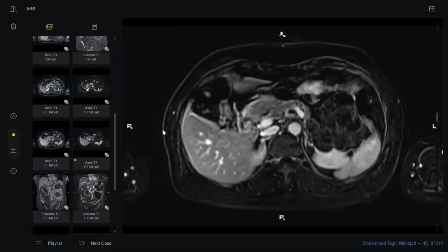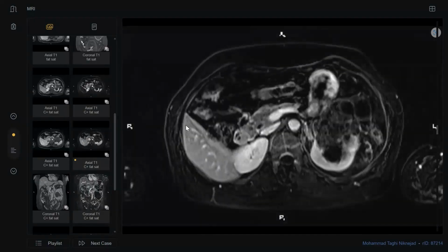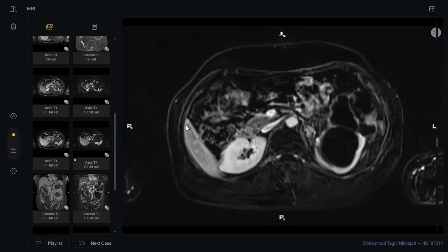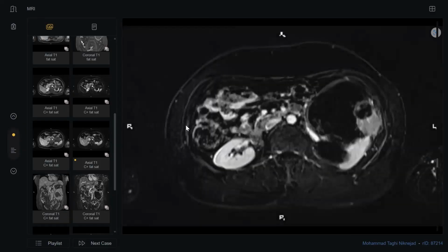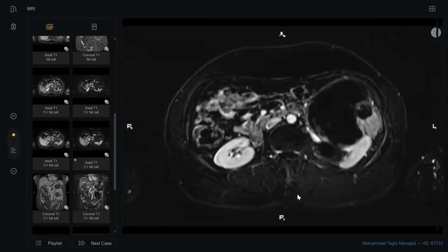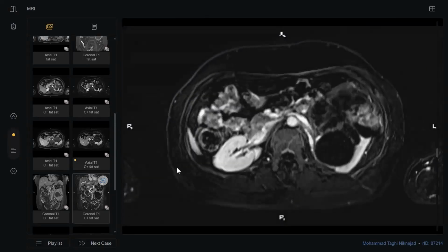I would like to check the T1 images as well. So this is T1 fat sat with contrast during the portovenous phase. I would like to check. There is no solid component or thick enhancing septi, but are you sure? Doc, no, I'm not sure. No, okay. There is what appears to be a solid enhancing component peripherally within the lesion. Also, there's enhancement of the septi and the wall of the lesion as well.